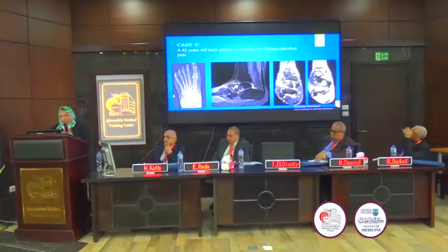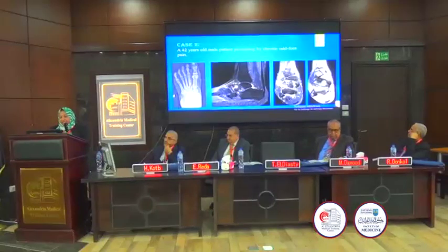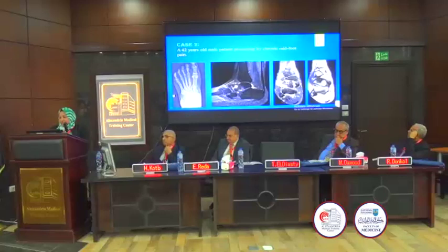When the patient proceeded to MRI, we found advanced talonavicular and calcaneocuboid degenerative osteoarthrosis, this means mid-tarsal osteoarthrosis. Again there is an abnormal shape consistent with that seen on plain X-ray, and there is a separate bony ossicle at the lateral aspect of the navicular bone. This is again an uncommon variant called the bipartite navicular bone.